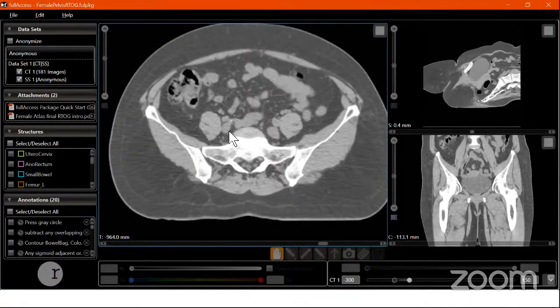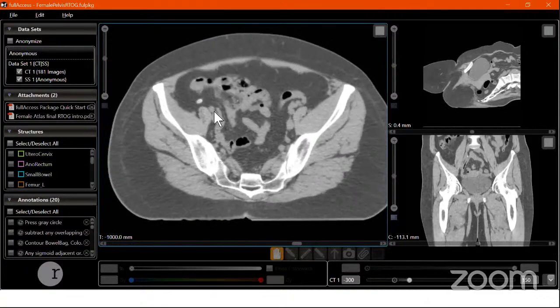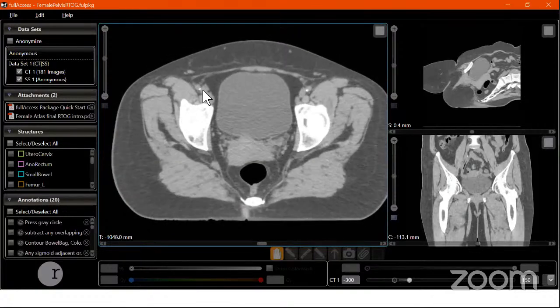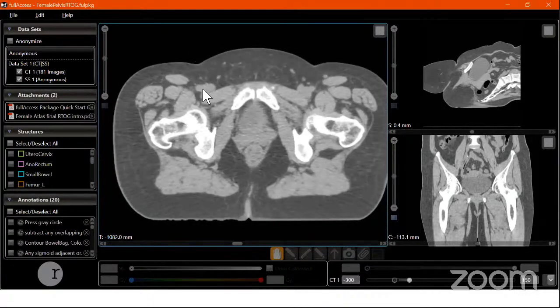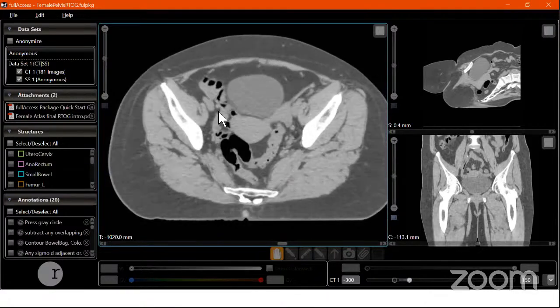So at this point it is divided, and then the internal iliac is going down here, and this external iliac keeps coming down. As we come down, the external iliac is renamed as the femoral artery beyond the level of the head of femur. So as it goes down along the femur, this becomes the femoral artery. Fine, okay. So let's go back again to the bifurcation.